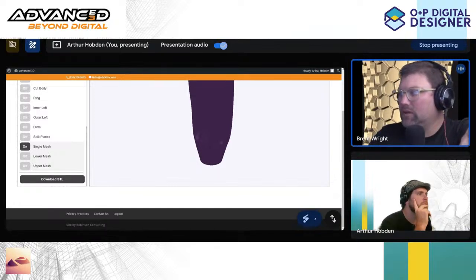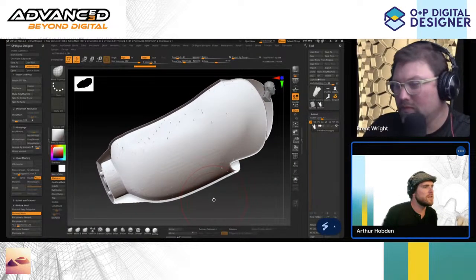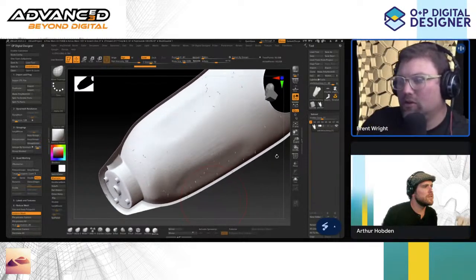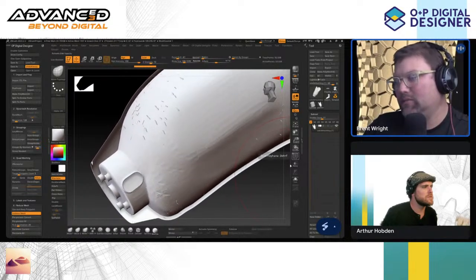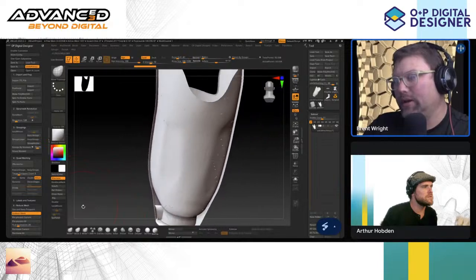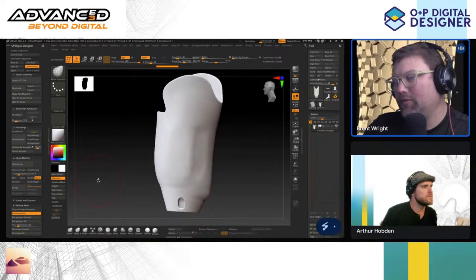going on. Did it download? Is that the right one? It is. There it is. All right. So you can see that when you go to a higher voxel, you're going to see some artifacts, but it's going to be fine for FDM. And when you do just a higher voxel count, you're going to be a lot cleaner.